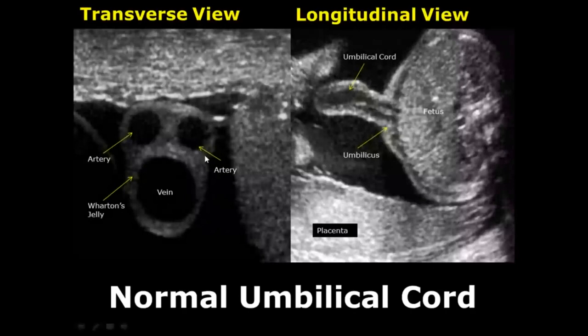Today we will study umbilical cord appearances on ultrasound. The umbilical cord connects the placenta to the fetus and provides blood supply.